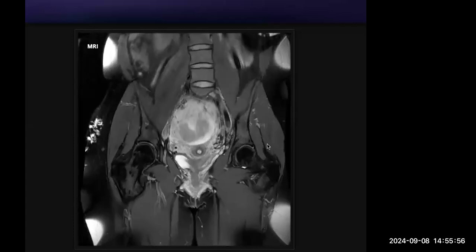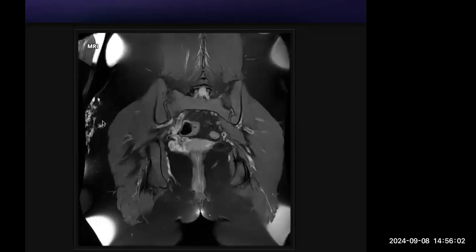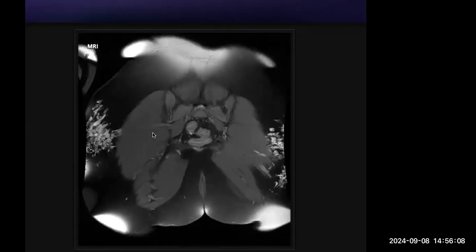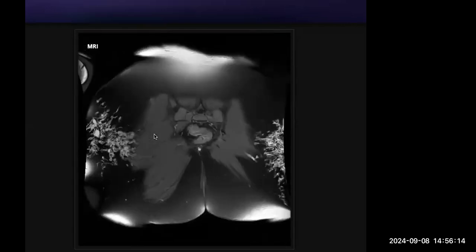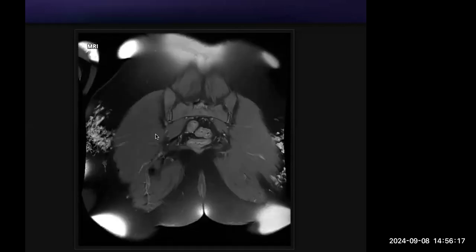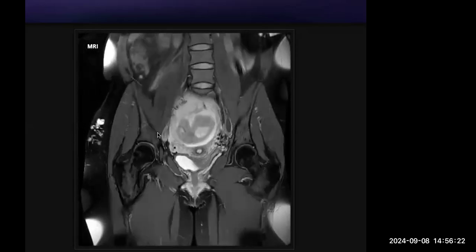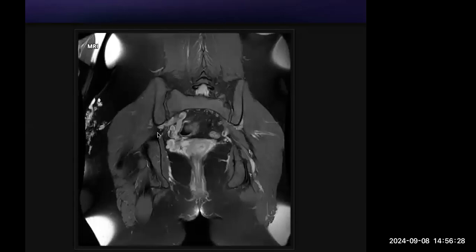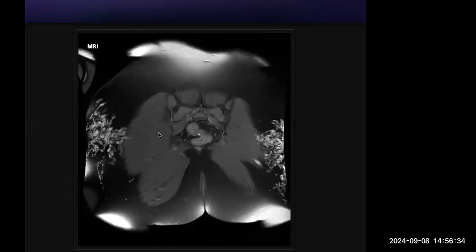So, a pregnant female with ill-defined T2 hyperintensity. Any history that you want to elicit? Any known case of metabolic syndrome, diabetes or something? Apart from that, for subcutaneous hyperintensities I'm not able to come up with any other differential.